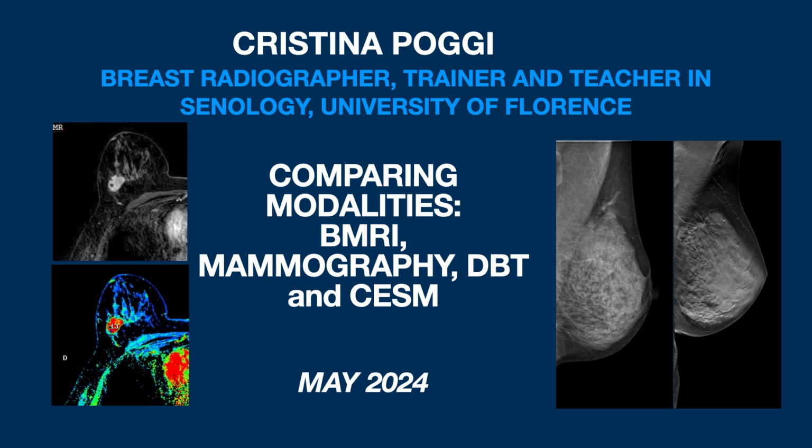Hello everyone! While waiting to find models for my mammography positioning videos, I thought I would offer you a lesson that I hope you find interesting, comparing breast MRI images with mammography, DBT and CESM images.